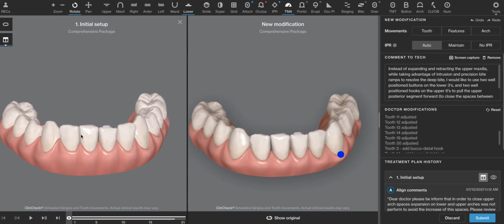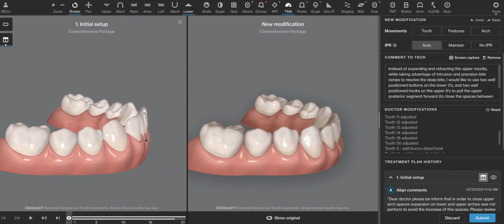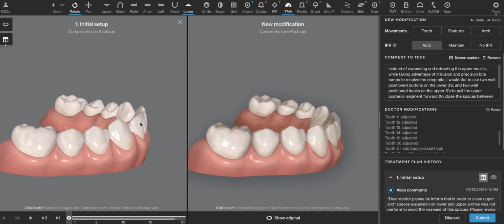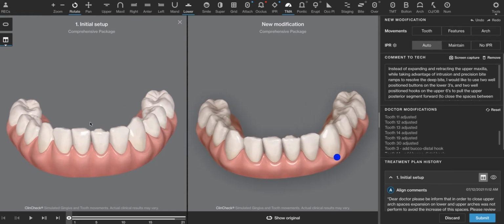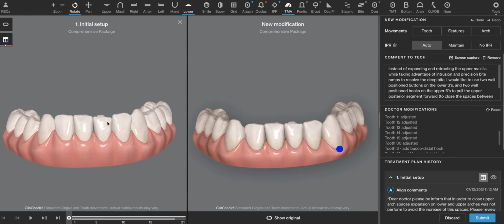As we align lower teeth and we tilt them forward, the gum tissue tends to recede. And there's a saying in orthodontics that you have relative intrusion of teeth when you procline them. And it's just because when you procline them, they tend to tilt or dump down, giving the appearance that they're intruded, when in fact the actual apex of the tooth might be at the same vertical dimension. With that said, we're going to try some intrusion here.